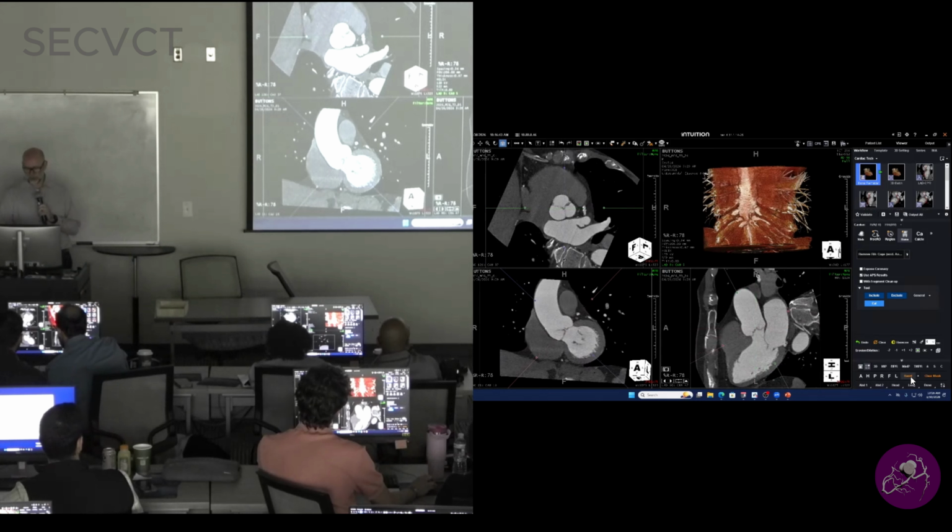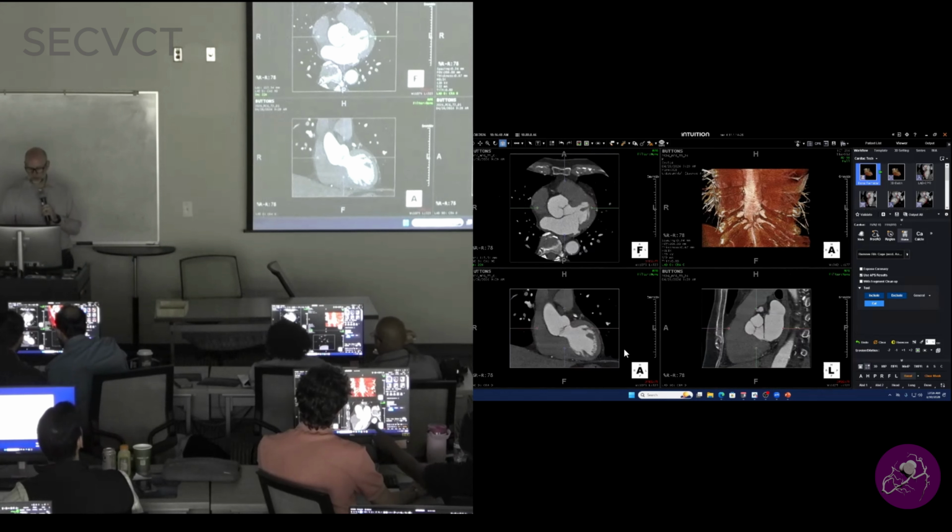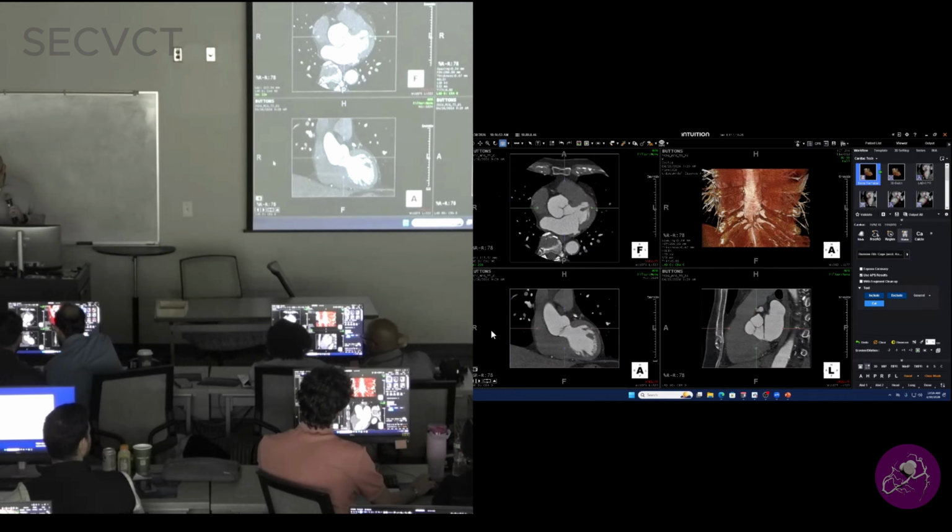And then you can use these little circles to double oblique. If you start double obliquing in multiple different ways and you kind of get lost on where you're at, there's a little reset button on your bottom right, and that'll straighten your study back out for you.